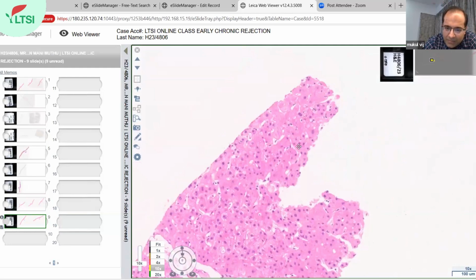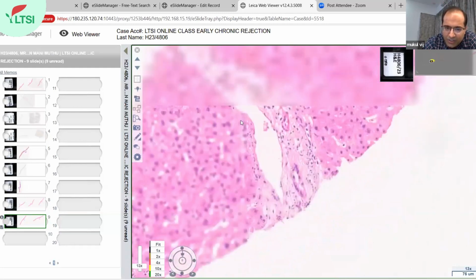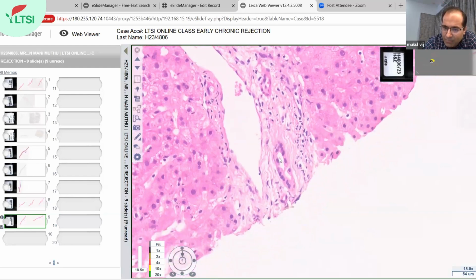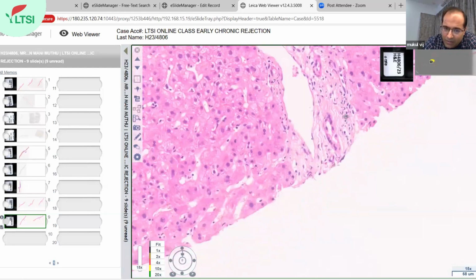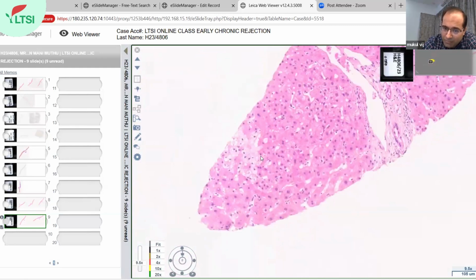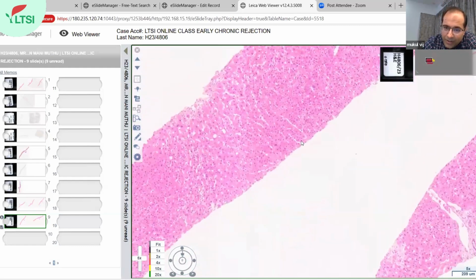So, Prof, in this biopsy, you see this is the portal area. There's not much inflammation. This is a portal vein. There's an arteriole. This is the duct. There is some injury. That's why it's important, even when there is a very slight inflammation, you can see some injury in the biopsy. There is loss of nucleus, possibly apoptosis. There is mild disturbance of polarity in this biopsy, maybe because there are some collections of foam cells. You're not seeing much inflammation, but there are foam cells in the sinusoids.